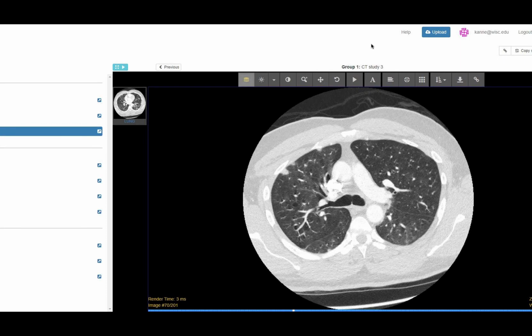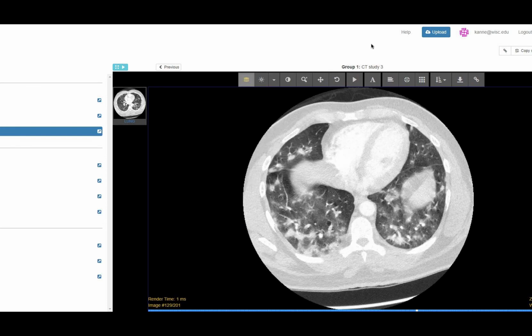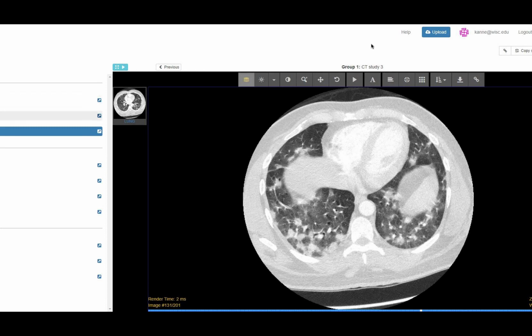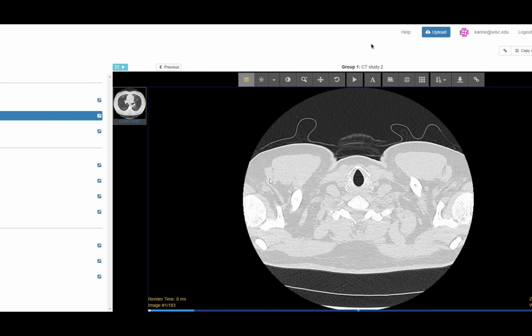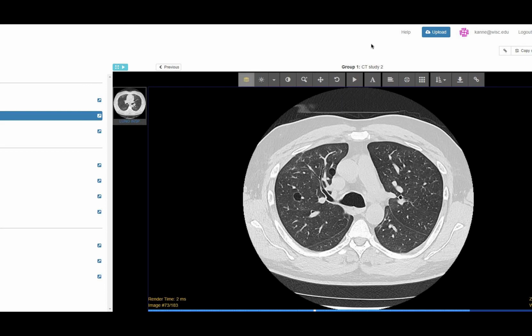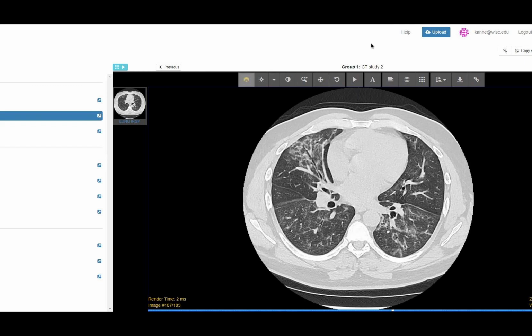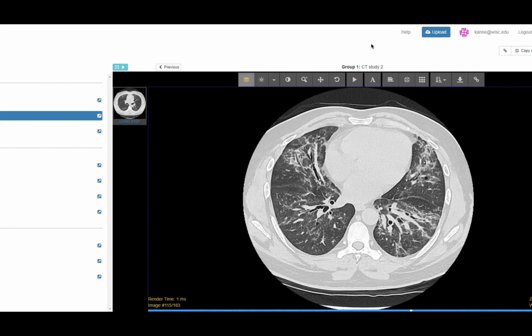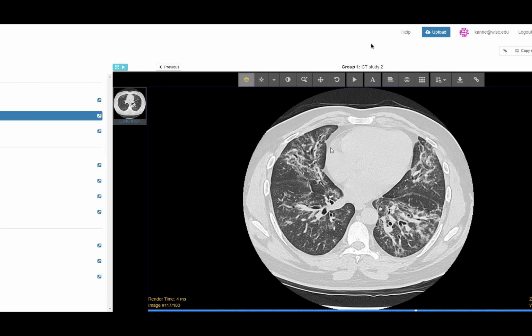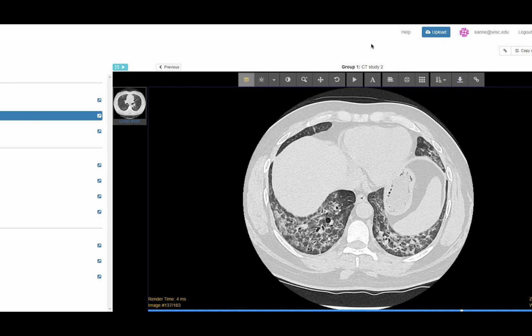There are a couple cysts in the lung, which I think are completely unrelated to the acute lung injury, but presumably part of the Sjogren. This was done on the outside. Then they came back about 6 months later. I presume they got some steroids at that time. It's another outside study, and you can see that the nodules and consolidation have gone away, but now we have this lower lung predominant peribronchial ground glass opacity and a thickening. It's got a subtle reticular abnormality, but with some nice subpleural sparing in some areas, you can see right posteriorly, and maybe starting to get a little bit of airway dilation. There's one of those cysts.